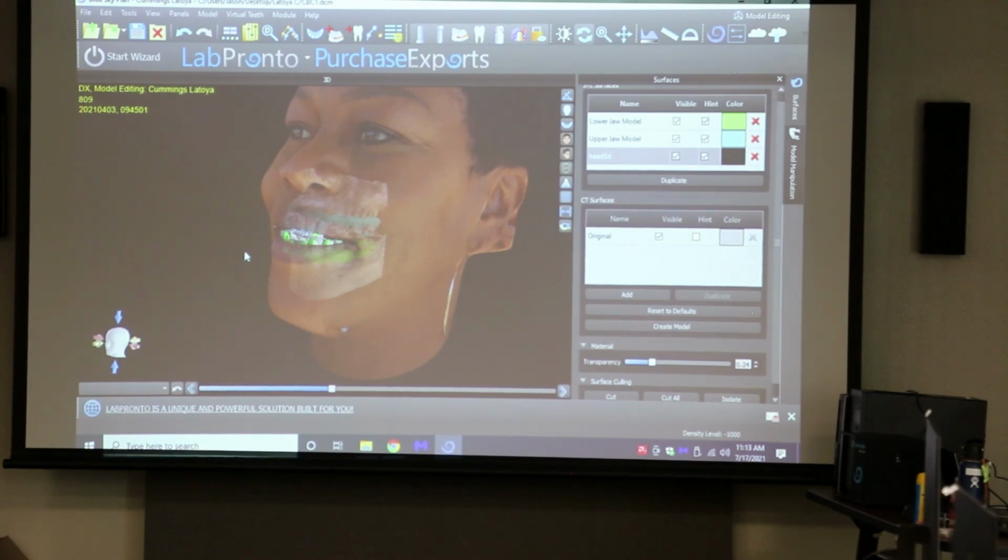Nice. Yes, I can't really tell. It's hard. It's really close though, for the purpose that you're hoping to use this for. Can I just, help me understand the bigger picture? So what I was seeing was this blue right here, I was trying to bring it forward, but I seem to manipulate the arch a little bit.